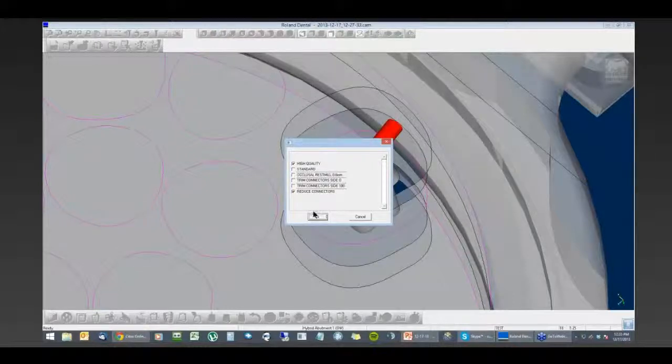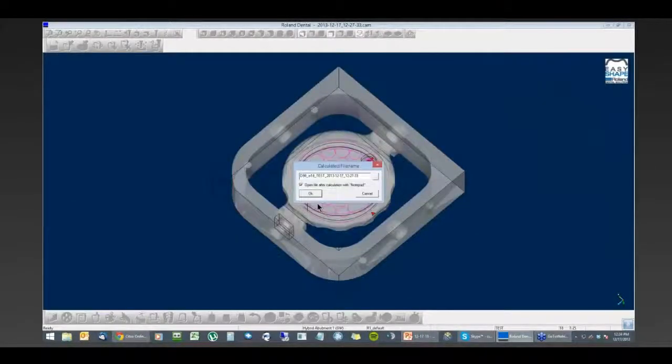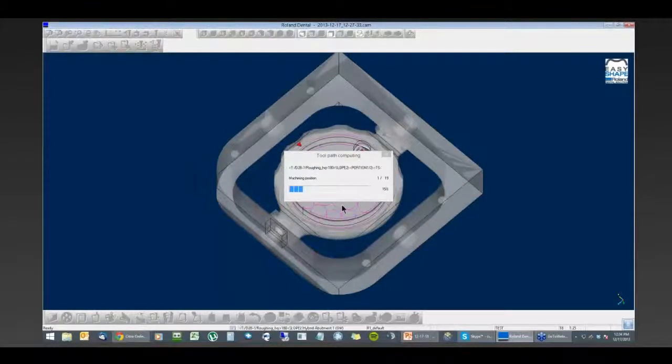One of the more important things that you definitely want to check out with your distributor before you try milling this is that they've actually incorporated the hybrid abutment milling capability into the software. If they haven't done so yet, when you import it, it may not even apply the correct toolpaths, or it may not even calculate at all. So that's very important. Also, if it's not showing up under the selection menu, it could be because your reseller is testing that functionality first before they get it out to you. So definitely check with them before you try milling any of this.